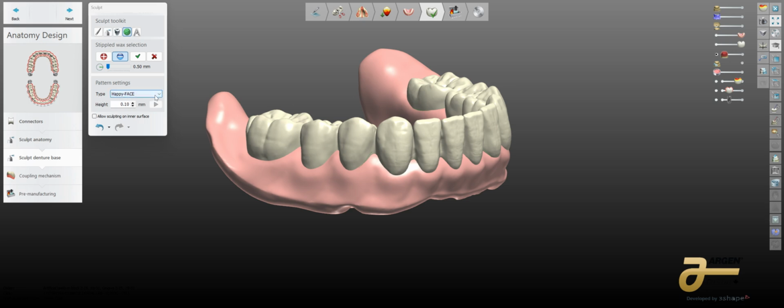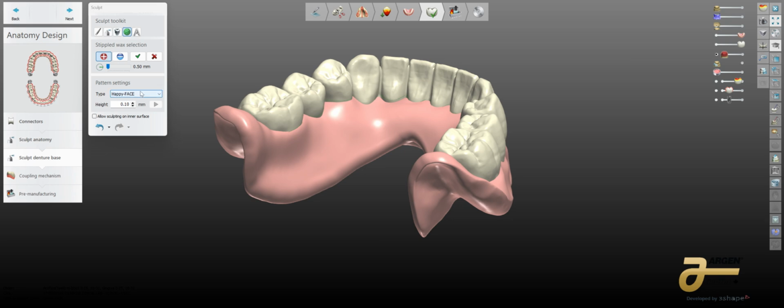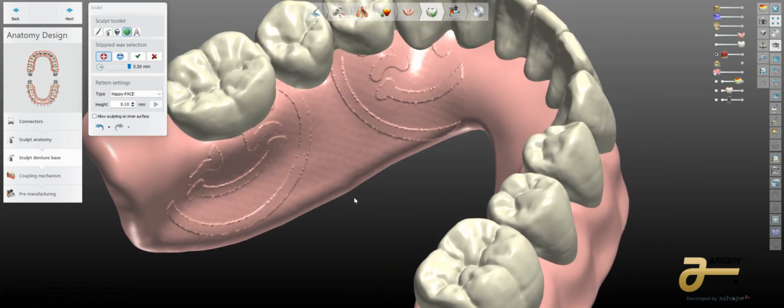It's kind of fun, but hell, maybe I can do that real quick just for fun, just to see what it's like. So let's go ahead and make it a little bit here, and we'll just do something. And let's go ahead and just produce it with that stipple that I made. Maybe not big enough surface to be able to see it, but we'll see. So you can do some fun stuff in here.